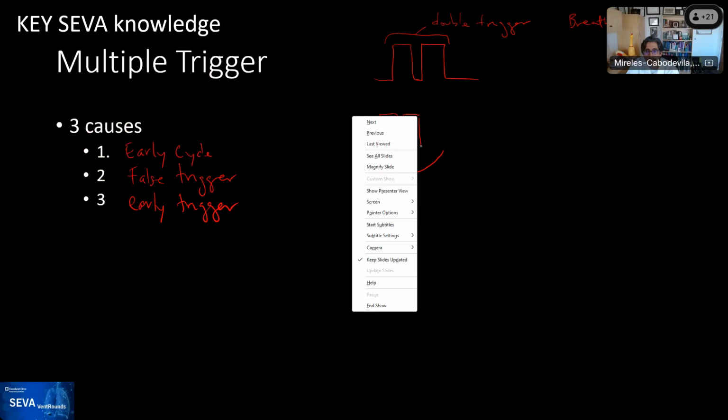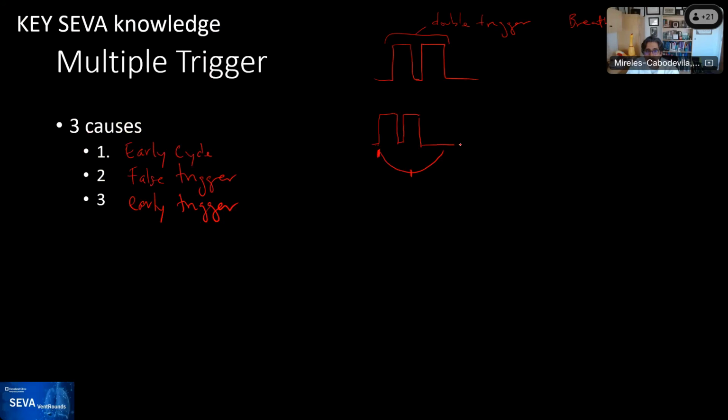And then the patient exhales. So this is just the pressure waveform. It was patient triggered. Both breaths were triggered by the patient. And the PMUS was from here and triggered both. So that's what an early cycle is.